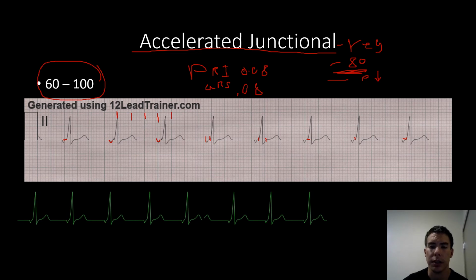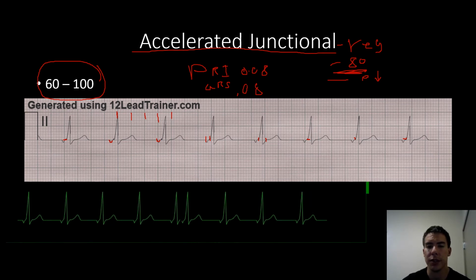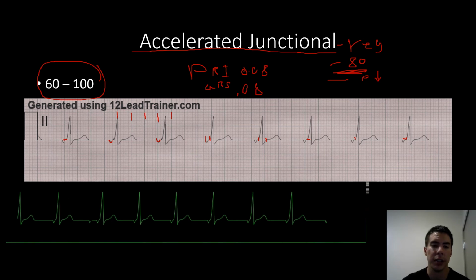And then here's the dynamic cardiology, which I just include in these videos. Sometimes, like with junctional rhythms, it's not super important, like it doesn't tell you anything, but it's good to look at, I guess, and just kind of see what it would look like on a monitor.